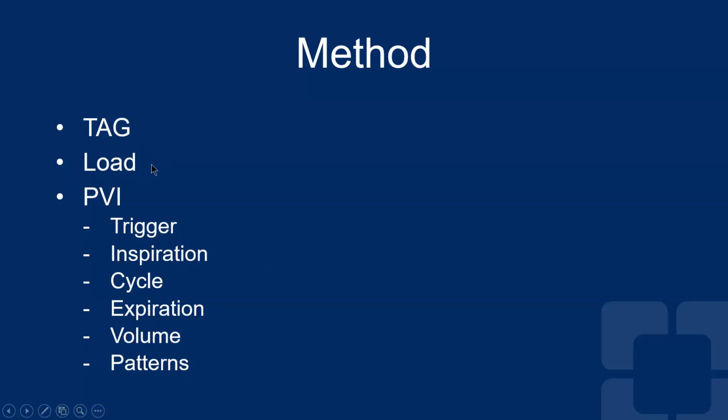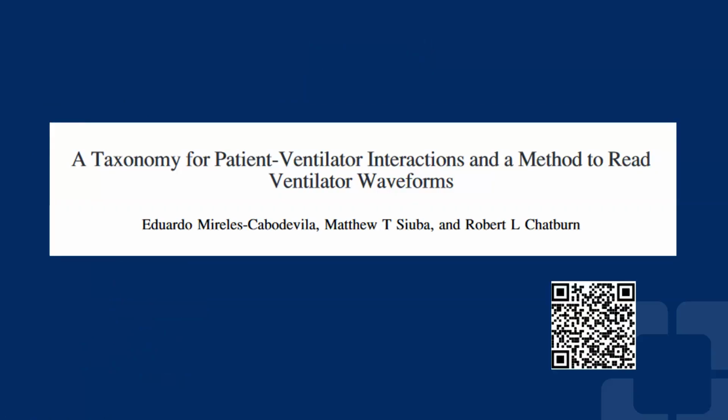We know that this is pressure control, so rapidly we recognize that, and every single breath seems to be the same size. So I'm going to say that this is CMV, and I'm going to stay there for a second, since all the breaths are mandatory. And the question that they ask is, what condition does this patient have? Actually, from just looking at the waveforms, we can rapidly ascertain what it is. So we see lung fibrosis, pneumonia, pleural fibrosis, and emphysema. The answer to this question is emphysema.